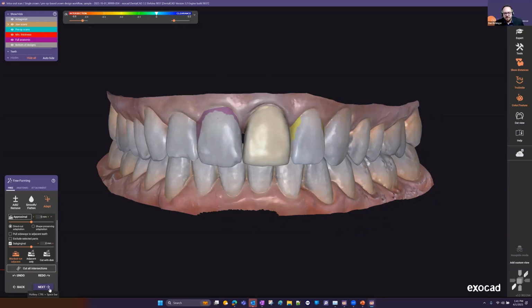Again, instead of selecting next, control plus the space bar. Now, if you look here, how I'm hovering, I'm seeing that tooltip. It's another thing to consider when you're utilizing a software for the first time. As you go through and hover over these tool buttons, you can see a hotkey is assigned to the majority of the functionality in our software. Now, whether you're somebody that loves hotkeys or not, those are readily available for you, and it'll basically just make you more productive quicker. So something to check out, fully recommend that.